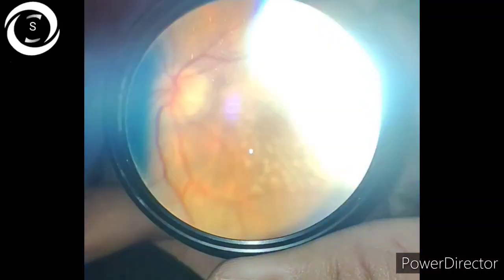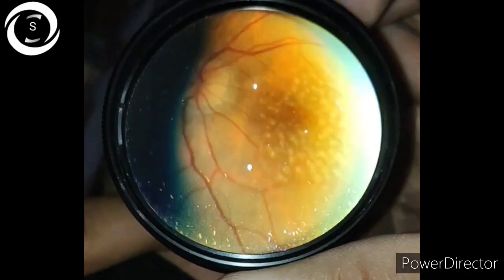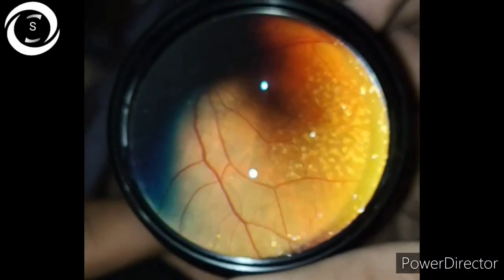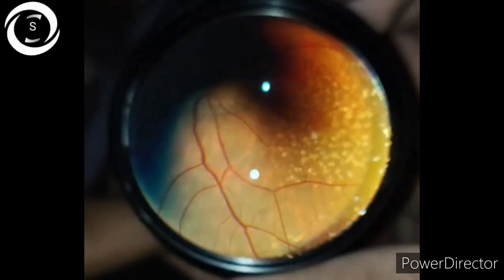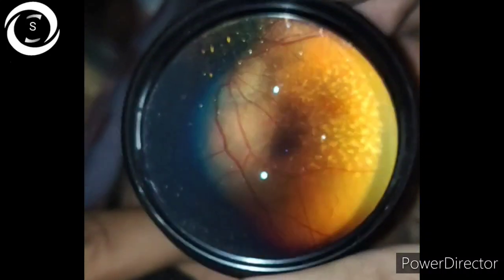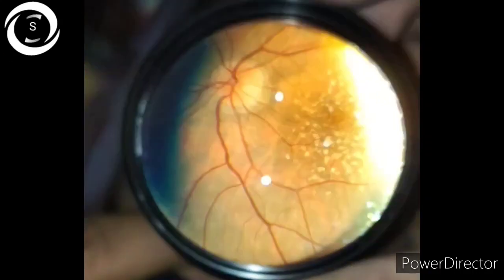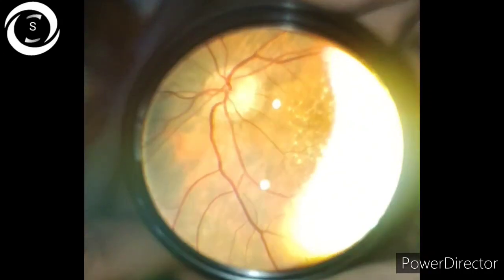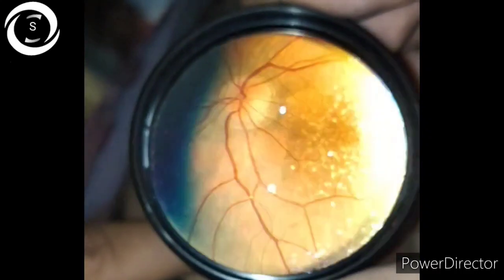Now let's solve the challenging case 93, which is of retina or fundal disorder. Here I am showing you the fundus of a 40 years old female patient, and you can see that there is a pathology on the fovea, on the macula, multiple tiny dots, yellowish in color, all around the fovea and on the fovea in both eyes.